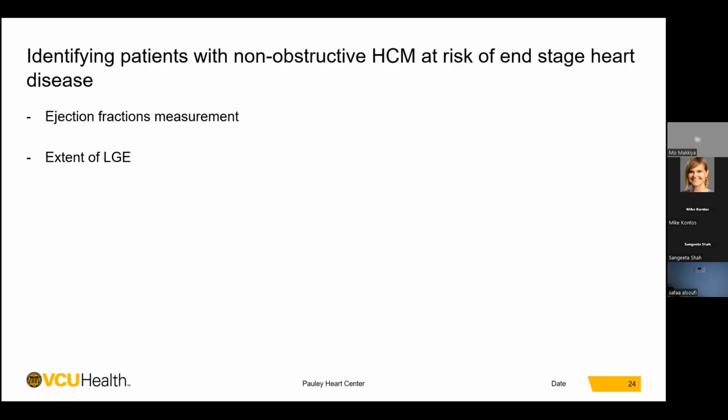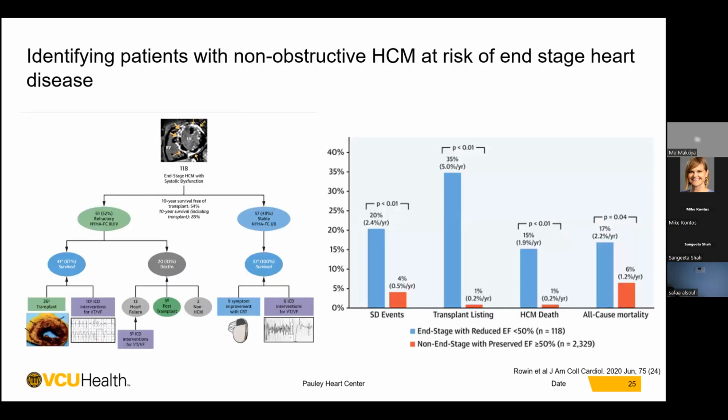And this happens, if it is truly due to disease progression from HCM, usually due to extensive replacement fibrosis, and CMR can play a big role in showing that and showing the degree of fibrosis in patients who have hypertrophic or sarcomeric hypertrophic cardiomyopathy who drop their EF, not secondary to arrhythmias or other things like coronary artery disease, but truly due to the disease advancement. And it will help in the treatment, importantly.